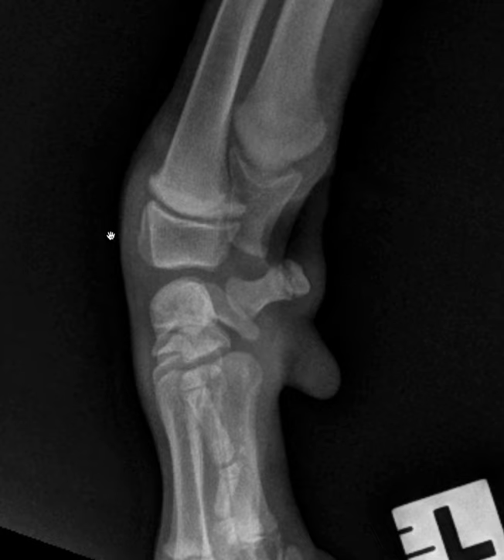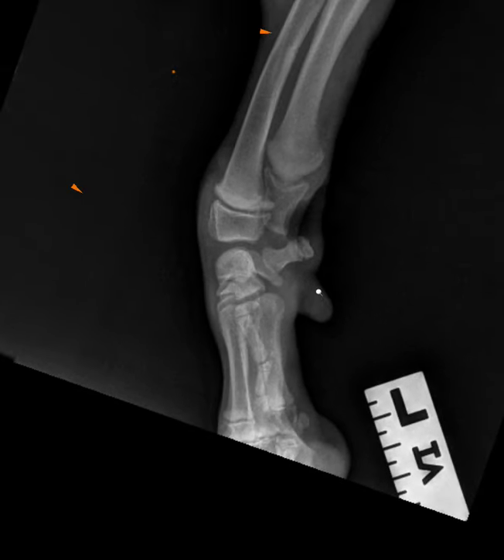And of course, there is the odd spot that doesn't look perfect. Like if I were to look at an area of margination, I could point here and say, well, that little piece of the epiphysis looks slightly different. But I have to say, when it comes to physis, the key is let's not overread them because things can change quite rapidly there. We know that it's a young puppy, a large breed puppy growing quickly.